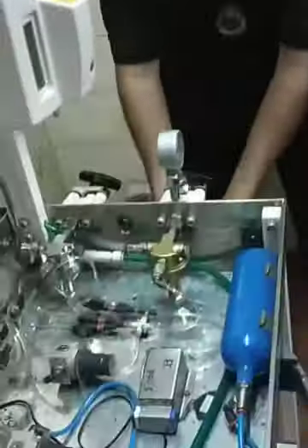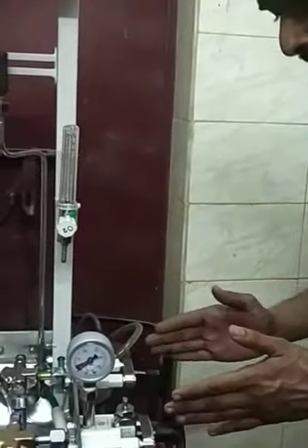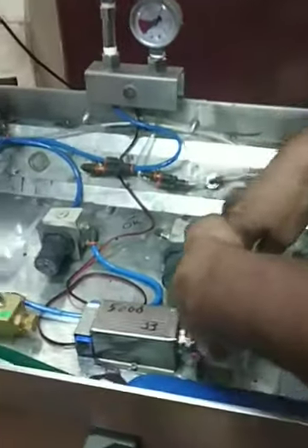Now we are going to try to understand in more detail about the anesthetic machine. So this is the oxygen cylinder. Now I'm not going to run the machine, but I'm going to make you understand the flow of oxygen. Now follow my hands. Imagine this is the flow of oxygen. So these two are my oxygen cylinders. One is connected at a time. So oxygen is coming from here, okay, and this is getting connected over here.